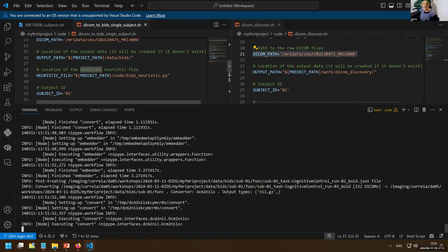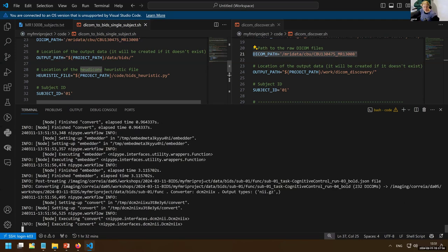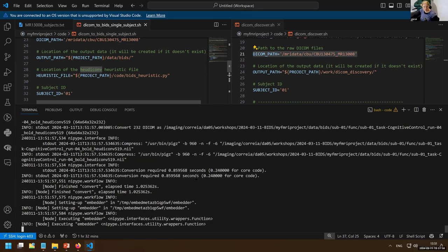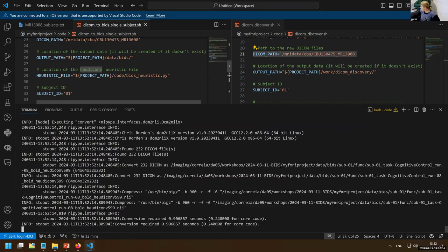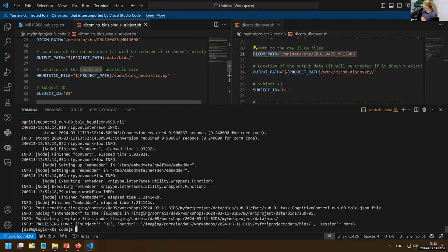Well, if you have something like that, that means that everything is doing fine, even if it shows some warnings or something, it's just doing it. Yeah, usually it takes like a minute or so for this size of data. I mentioned it just because when I built it myself the first time, it didn't work because I didn't have it added to path. I was like, it's gonna work.